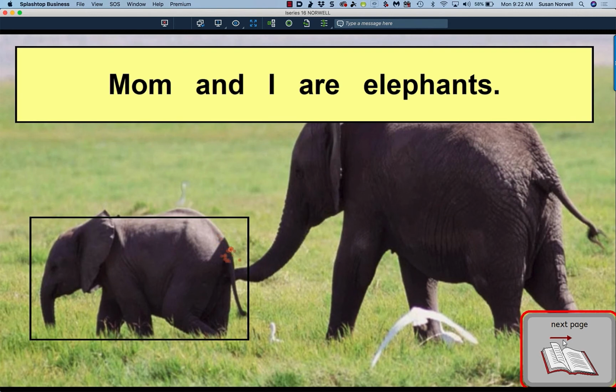So here you've got a baby on this side, and you've got the mom over here, and there's a bird down there in the corner. So you've got plenty of things to look at. So just think about some pictures of things they like. I'm not a big proponent of Barney for 28-year-olds or over-dependence on really kind of babyish things. But in this case, if that's what they like, then that's what we do. We put stuff up there that they love, and we see where they're tracking.